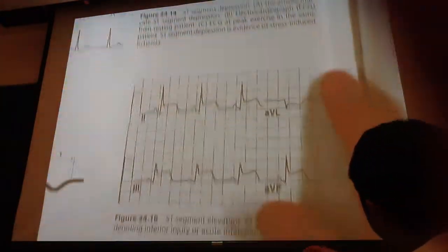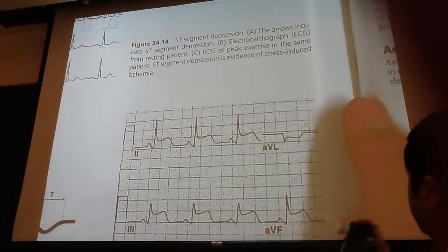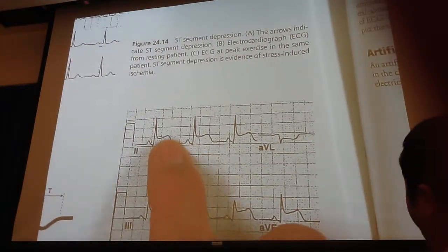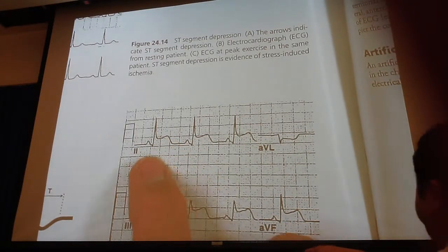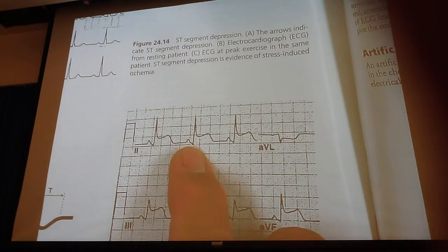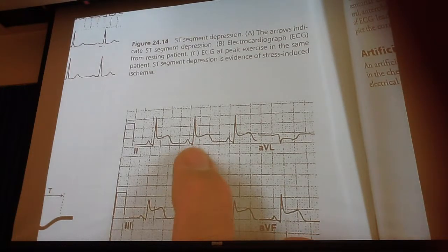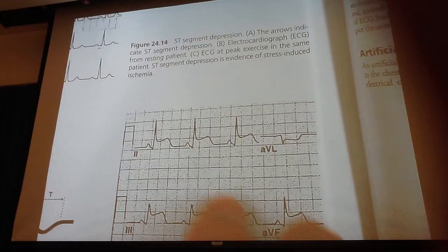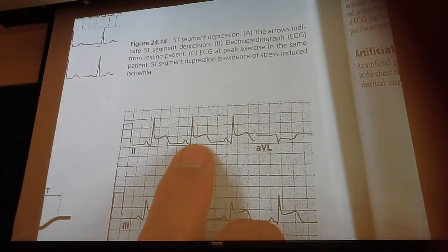Going over here, okay, what's going on in this case? Okay, the ST segment is elevated. Also, what else do you see here? Where my finger is. Well, what I'm concerned with is this depressed area here, where it's a lot more prominent than you would normally expect.